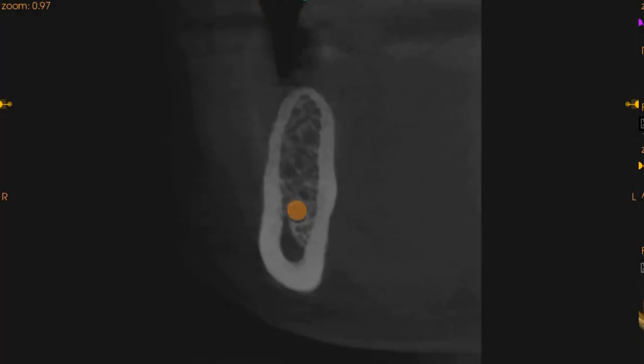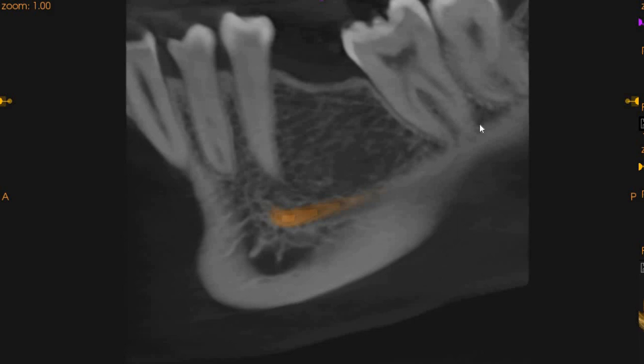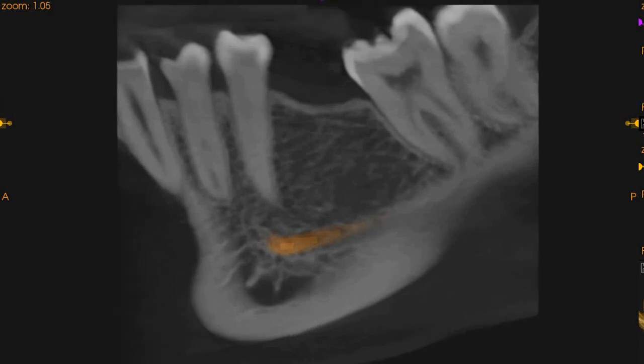On the transaxial section, but before that, this is the sagittal view. On the sagittal view, which is going to be side to side, we can see that we've got the second premolar, the second molar, and we've got the second molar tilting. So there's going to be a bigger embrasure space for the restoration. But we've got adequate bone quality that we can see on the sagittal aspect. No pathologies can be observed.